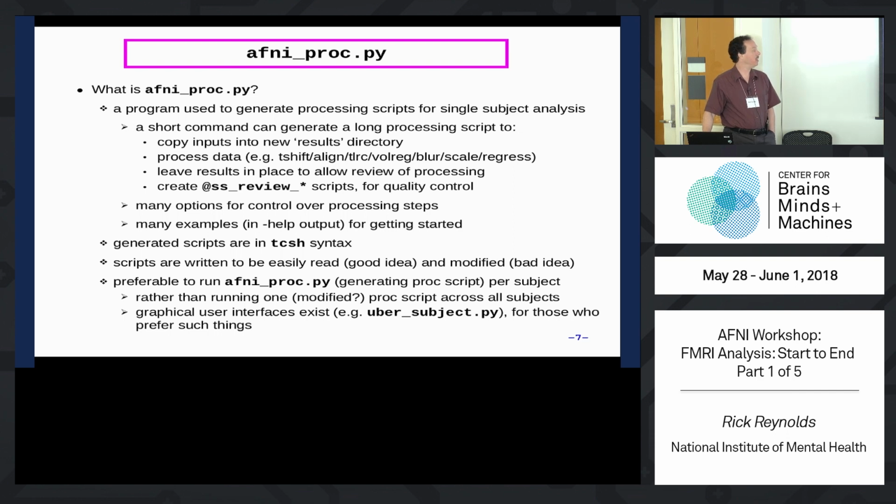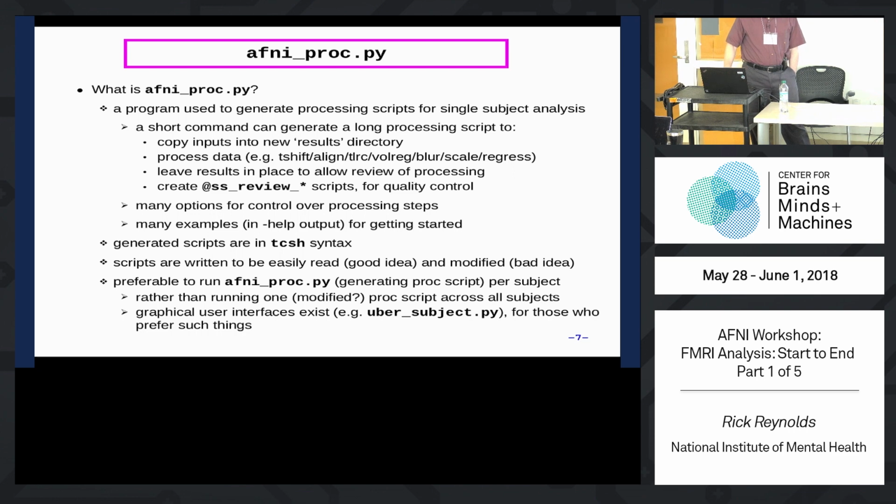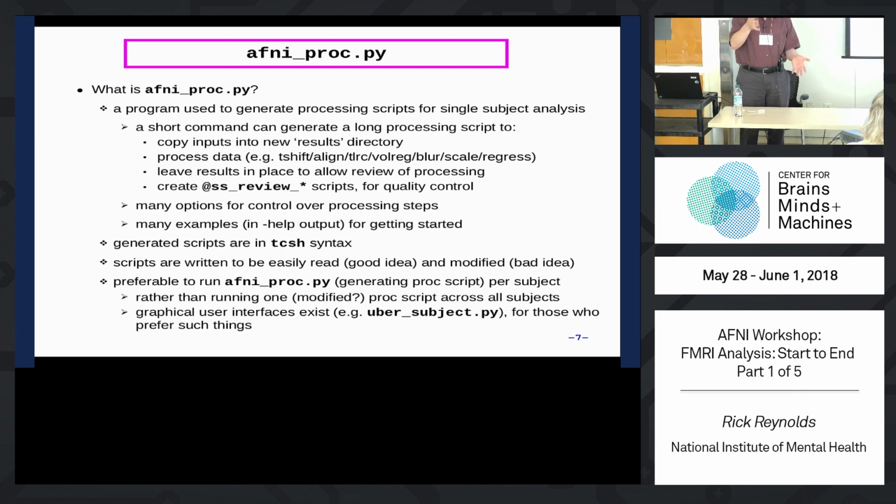The scripts are written in T-shell syntax. Again, T-shell is a weaker language than Bash, say, but it's more readable. So if you don't care to go too deeply into a shell language, this is just easier to read. The generated proc scripts are written to be easily read and modified, but you shouldn't modify them unless you absolutely have to. Again, these scripts are 300, 400, 500, 600 lines long.